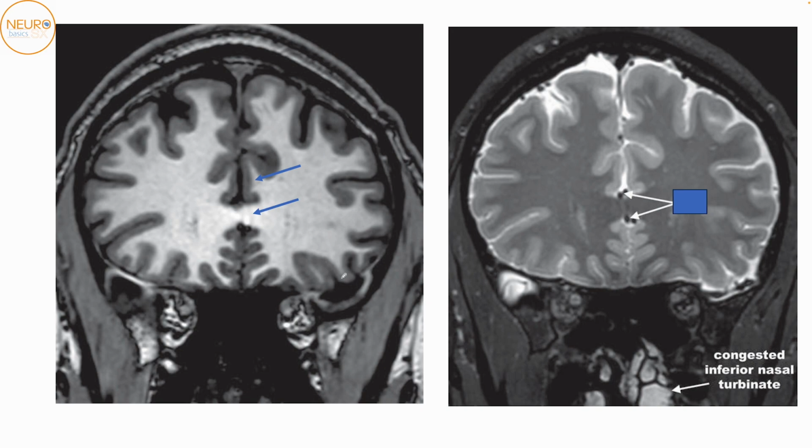Okay, as we go farther posteriorly, we're able to see the cingulate, and there's a bridge which is connecting both sides. So we know that the only bridge connecting both sides would be a commissural tract, and this commissural tract is obviously the corpus callosum. This is the genu of the corpus callosum located over here. So this is the first cut where we are able to see the corpus callosum. This is the genu of the corpus callosum.